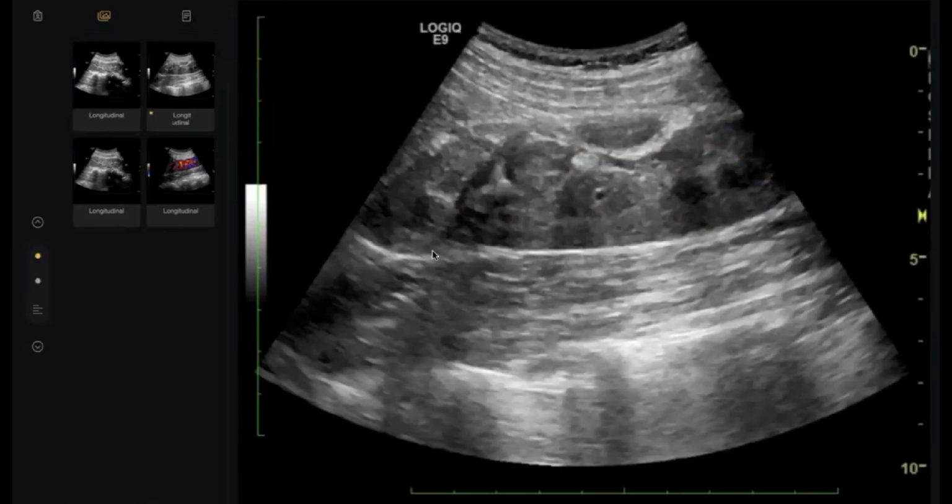Okay, look here. What is this? And what is this, do you think? It can be fused together. Yes. What diagnosis? I'm not sure where this is. Where is the location?